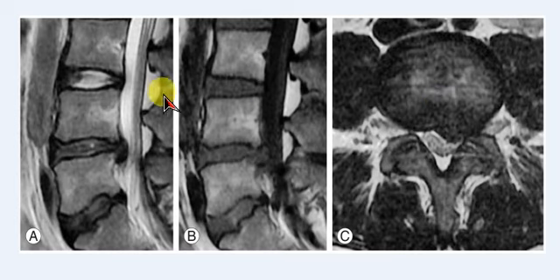Now there are two approaches. We can read an MRI image from posterior to anterior or anterior to posterior. So let's start with posterior to anterior. This is the spinous process. This is also a spinous process, and this is also a spinous process, and this white is the epidural fat. Epidural fat is outside the dura mater.